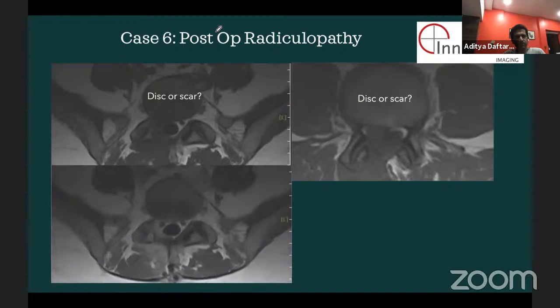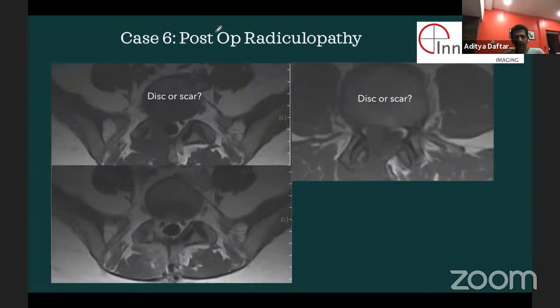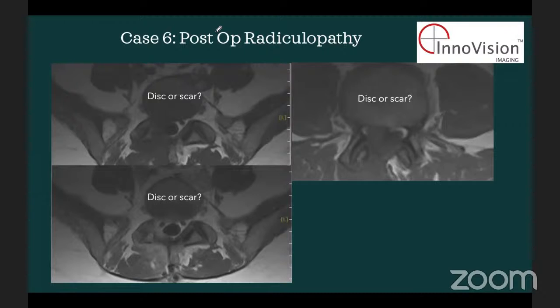Okay, so fine. Here's the post-contrast image on this one. So usually the left side is the axial cut of T1 and post-contrast images, showing there is peripheral enhancement in the right side foraminal region. That's like a radiologist answer. There is peripheral enhancement. So what is the question? So what is the answer?